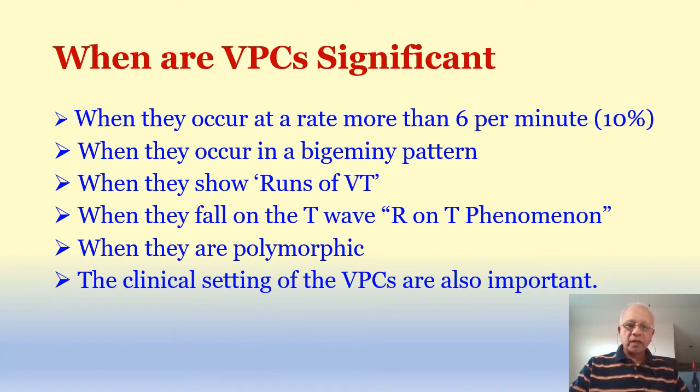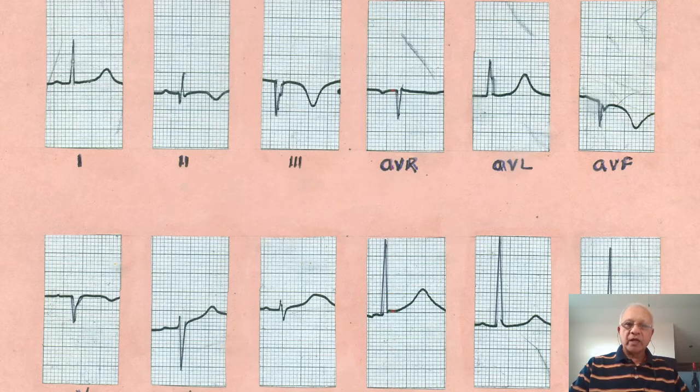So we'll go on to our next query. Now this is a 12-lead ECG of a patient who came to the emergency with a history of chest pain of 2 days duration and an occasional feeling of giddiness or near syncope. What is the diagnosis in this 12-lead ECG? What is the possible cause of the near syncope which you will consider? So one is the diagnosis of the 12-lead ECG. The other is what is the cause of this giddiness or near syncope which you have to consider in this patient. That's of course a clinical question.